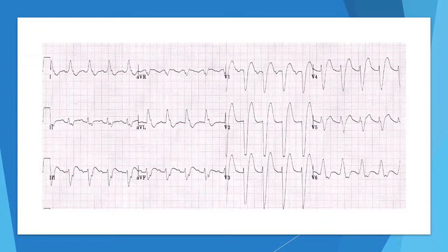Okay, and here's an example. You look at this ECG, and this can be a little concerning, especially in the presence of a patient who doesn't look so good. And so for a newer provider who doesn't know what they're looking at, this just looks like a mess, just a fast, wide, unknown rhythm. And so this is a normal left bundle. It's a little fast, heart rate's about 140-ish.